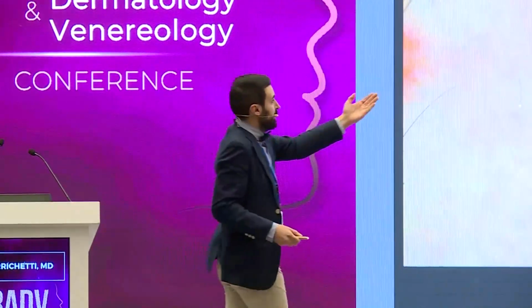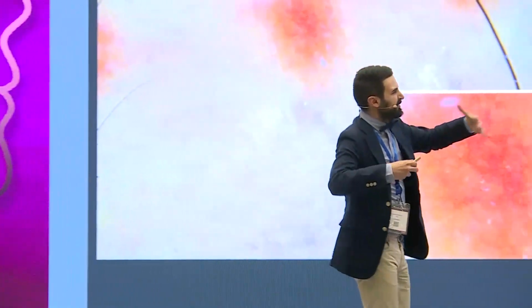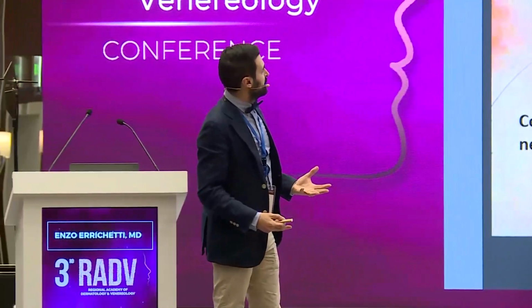What about urticaria pigmentosa? What do we have on histology? Yes, okay, mast cells, but we have a pigmentation of the basal cell layer. So we see a network. Or sometimes we see structureless brown areas when we have a lot of pigmentation, okay? Great. So let's come back to these cases.